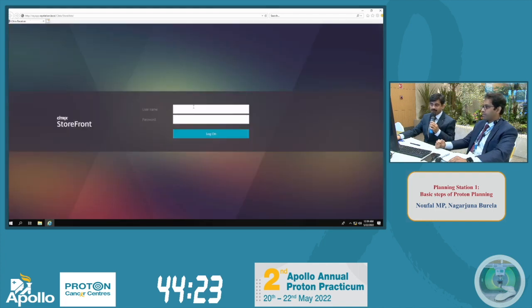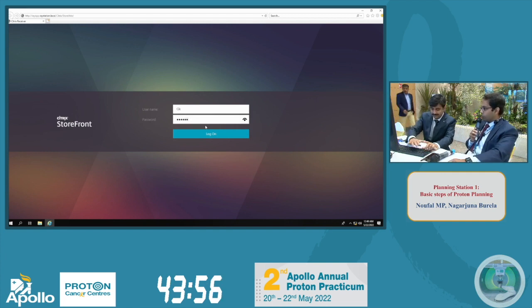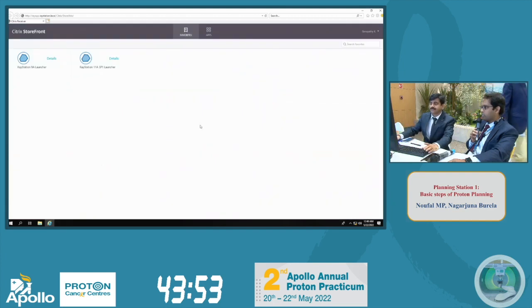Okay. So let me log in. So he is going to show a case of an 11-year-old kid with recurrent craniopharyngioma post-surgery. Post-surgery, there is a small residual in the sella and suprasellar region. We have done the routine target contouring, the residual contouring, and also a margin involving the sella and suprasellar region, with a 1 centimeter margin CTV, and a dose prescription of 54 gray in 30 fractions. And he will be showing us how he placed the beam arrangement.